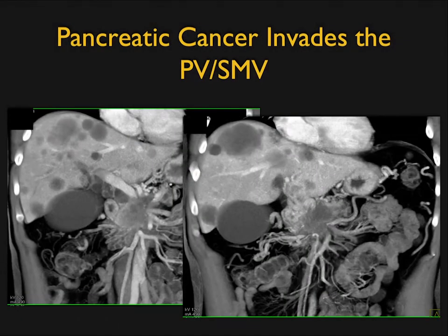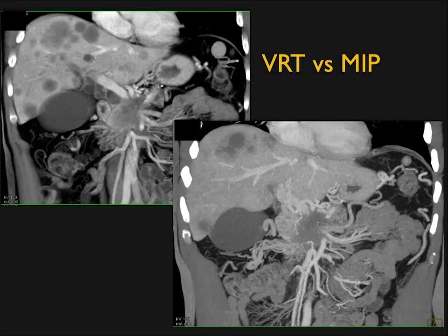We have done some work. Matt Weiss, when he was at Hopkins, was operating on patients with single hepatic lesions, kind of like colon cancer, if they had done well, so it's usually a year out. A patient like this with multiple metastases to the liver, that's just kind of a no-go, and that's kind of the worst case scenario. Of course, you look at the tumor, the portal vein, SMV, splenic vein confluence is gone, extensive encasement, extensive infiltration of tumor.